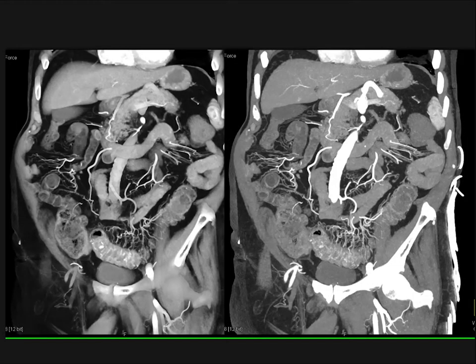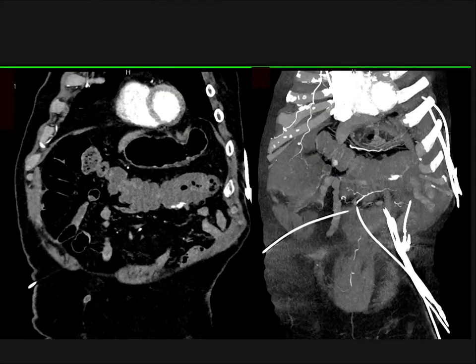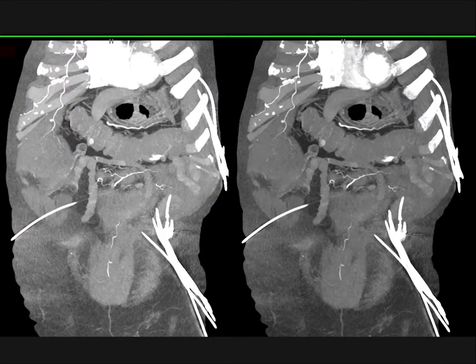This is the MIP. Look at the prominent vessels to the colon and the sigmoid. Look at the bright areas of enhancement, the active bleeding. And then look above again at the transverse colon. Here it is as I segment out the transverse colon a bit better. Look at the inferior aspect of the transverse colon. There's active bleeding there. This patient had 2 sites of active bleeding in the sigmoid colon as well as the transverse colon. That's quite unusual, but we do see it sometimes.